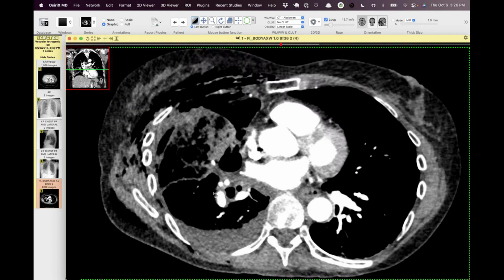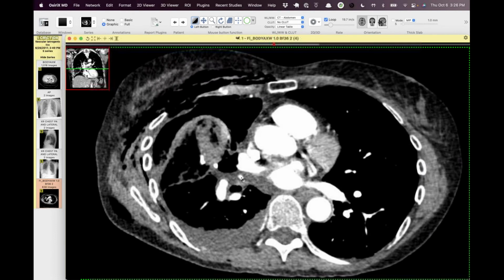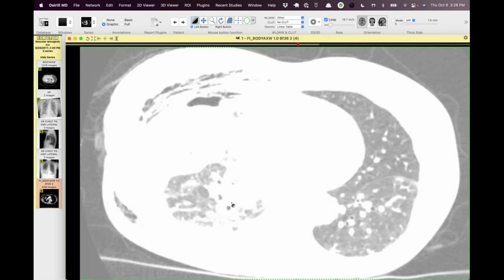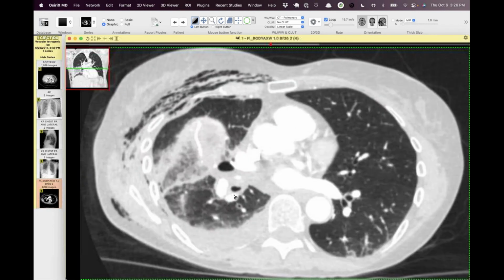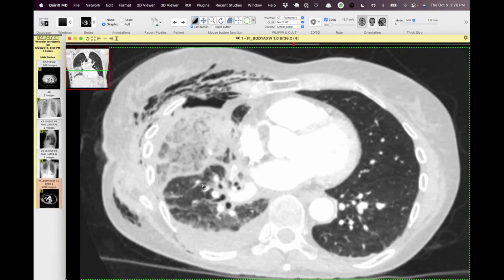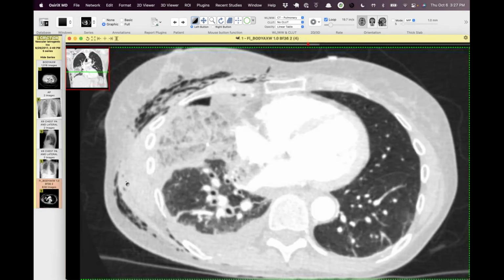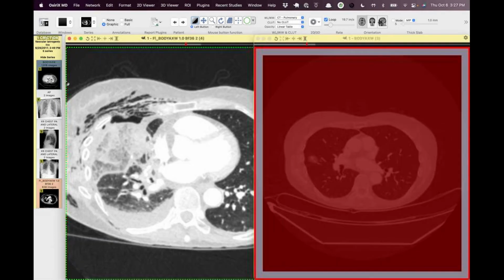This is kind of interesting because I'm still not exactly sure how this happened, but this certainly looks like that infarct in the last case. Somehow they took out the tumor, and they thought they had done a complete right middle lobectomy, but left a portion of the right middle lobe in. So this is all remnant right middle lobe that's been devascularized, both from the artery and the vein. When they were doing the thoracoscopic surgery, some of that lung just got left behind.